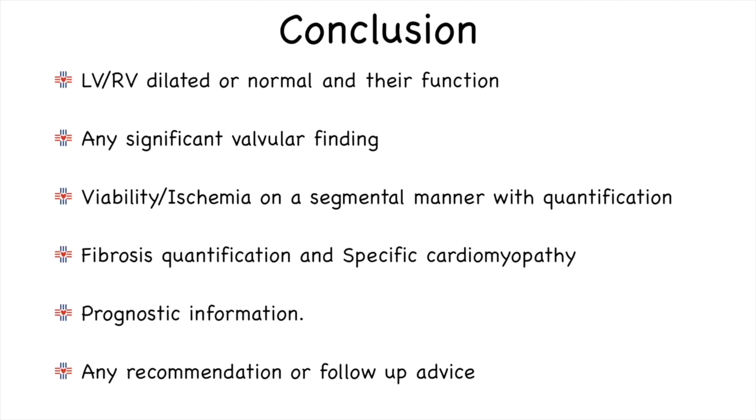In the conclusion segment of the report, it is important that we mention whether the left ventricle or the right ventricle is dilated or normal and what is their function. If there was any significant valvular finding, this also is mentioned in the conclusion.